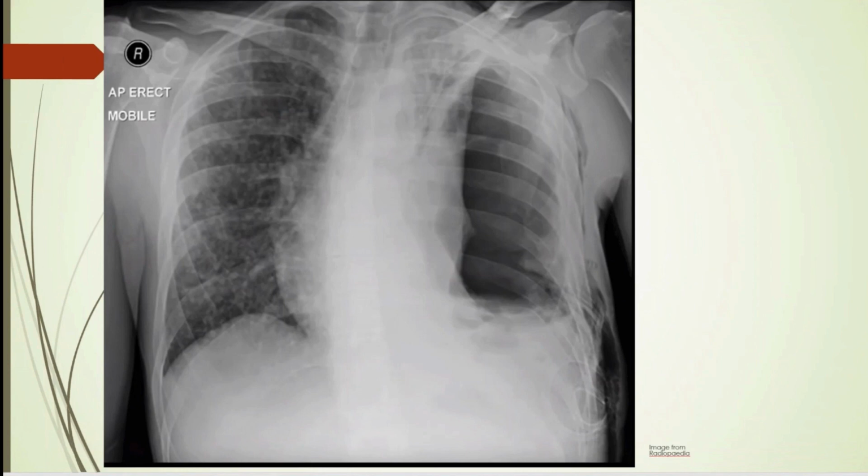All right, so here is a really interesting chest X-ray. And let's start off. Looks like this is the trachea here. It's kind of difficult to see, but it almost looks like it comes down here. This may be the bifurcation, but that seems to be up kind of high. So anyway, let's go into B for bones.